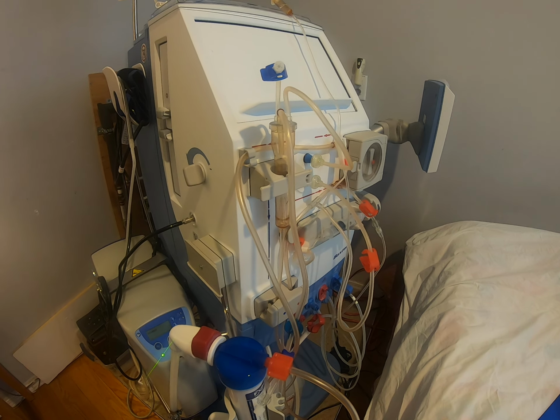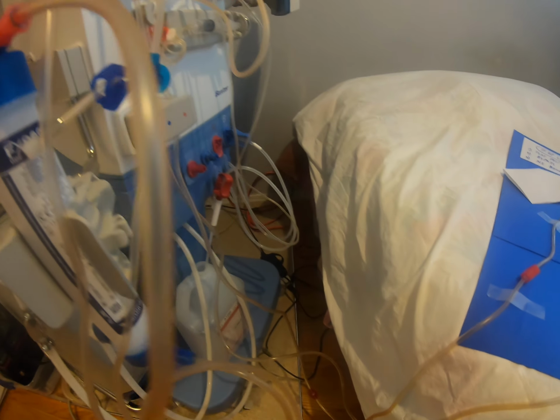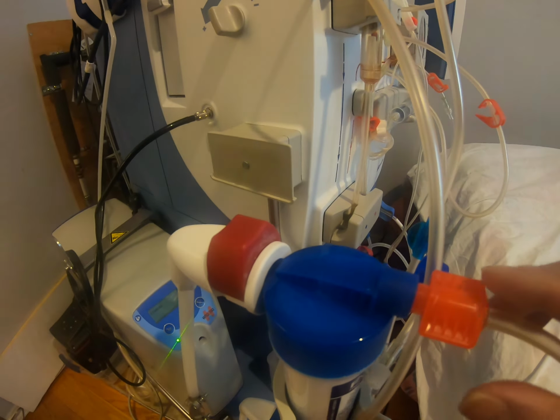Now, let's talk about also the blood. The dirty blood is collected from the patient via the arterial line. So dirty blood comes out here via the arterial line, and this dirty blood will go to our dialyzer. Let's trace the tubing. This is the red part, the arterial endpoint meeting with the dialyzer.